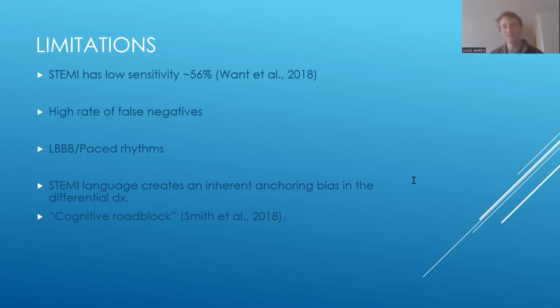But fortunately, there are some other systems that we're going to explore in this talk that we can use to critically evaluate our ECGs outside of the STEMI framework. And I hope that this is going to be really useful in becoming a lot more confident in taking the right sort of patients to the cath lab. Okay, hope that's making sense so far.